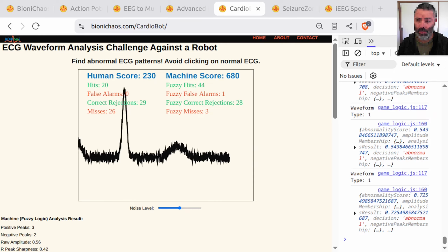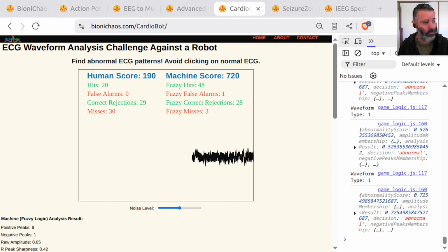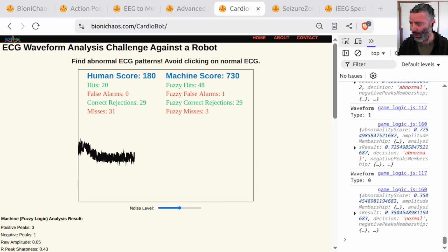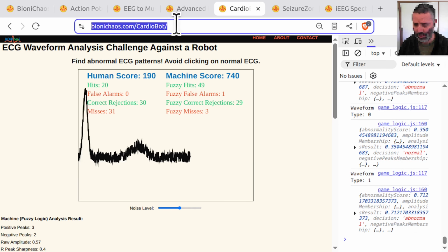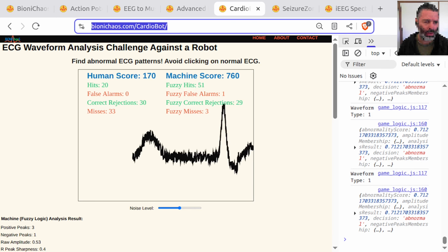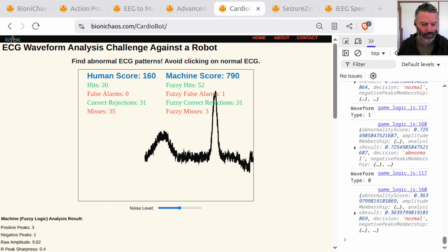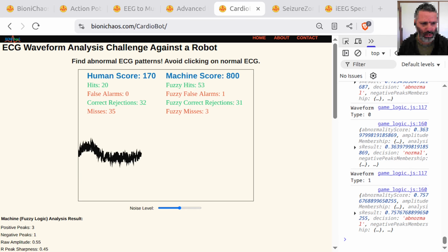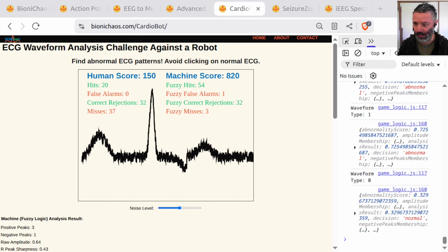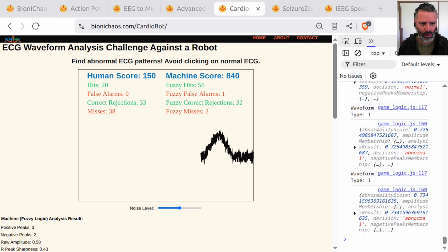We can give the code to Gemini. It has still been sitting there for quite some time and having potentially quite a major error. Just tested it in another browser. Wait, I'll run it locally first. The problem might go away. Is it CardioBot? Yeah, we also had CardioQuest. Oh, this is a Flask web application. Oh, I don't like it.